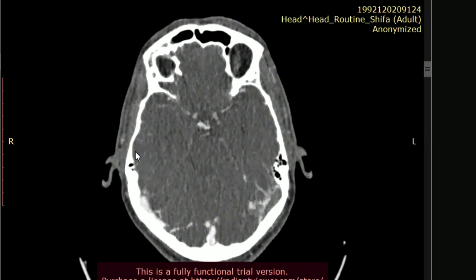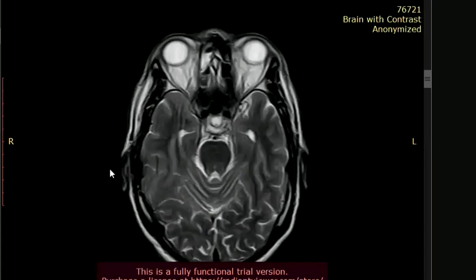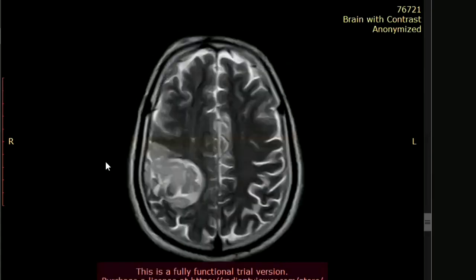So this is venous thrombosis causing infarct and hemorrhagic infarct. The venous infarct can be hemorrhagic or non-hemorrhagic. The purpose was to show you that there was an area of edema extending to the cortex. If you say this is ischemic infarct on CT, that's fine.